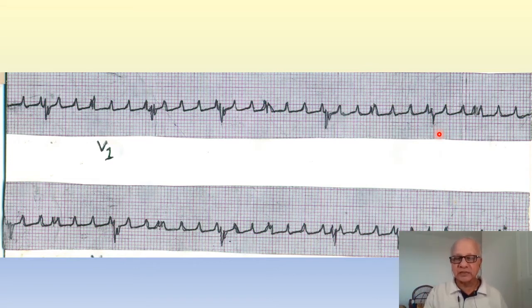The resident looked at the pulse, and the QRS complex is the one which gives you the pulse. That is coming at a rather regular rate. Look here, it is rather regular, isn't it? But occasionally there is an irregularity, just like here. So he possibly thought it is a regular rhythm with an occasional extrasystole. The QRS rate calculated comes to approximately 42 beats per minute, that is 300 divided by 7 divisions comes to 42. So this is atrial flutter with a variable conduction ratio, because of the slight irregularity which you see in the QRS complex.